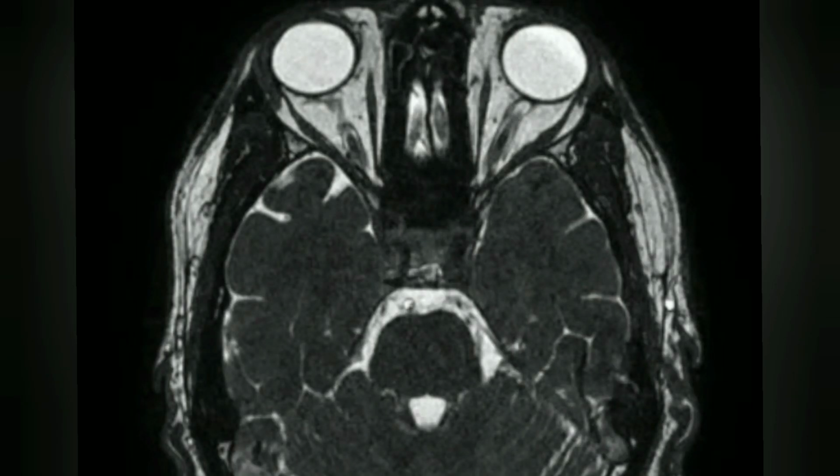Hello dear colleagues, today we will briefly discuss the MRI appearances of the cranial nerves.